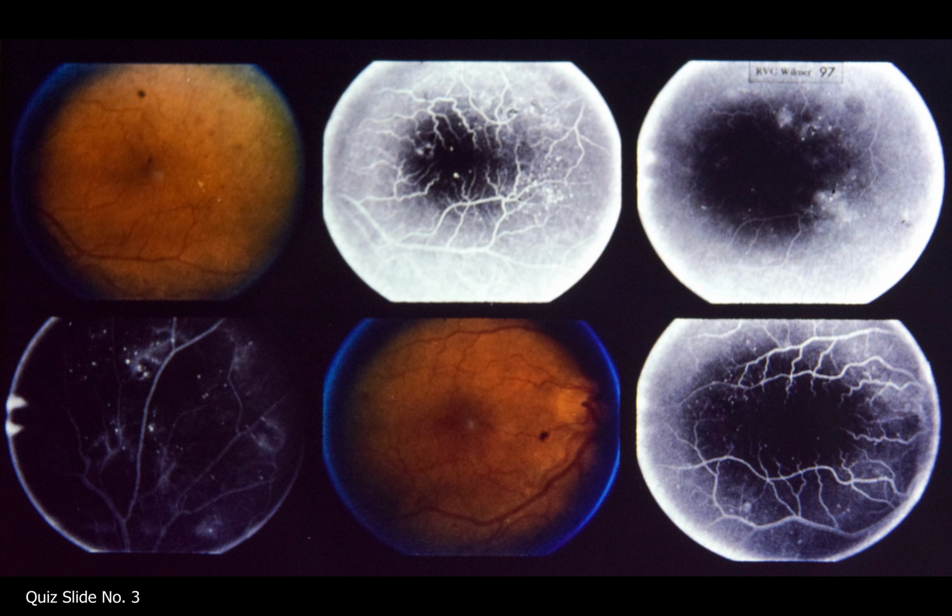Lower left, note vascular abnormalities and areas of capillary closure above left disc. The right macula, lower center and lower right, shows less severe vascular changes than the left macula. Prospective randomized trials at the Wilmer Institute and in a cooperative trial in London showed that photocoagulation is effective for certain patients with diabetic macular edema.